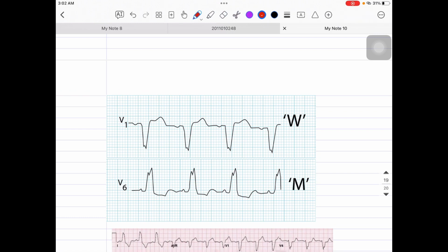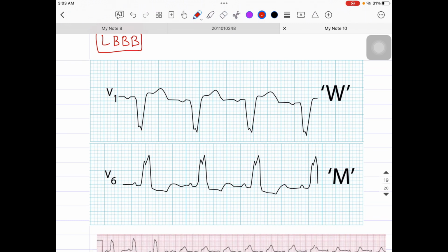So now guys, once we understand how to diagnose a patient with LVH through the ECG, we shall move on to left bundle branch block, LBBB, and how to recognize LBBB in the ECGs of the patient, right? So over here again, guys, we need to focus on two things. One is lead number 1 and another is V1 and V6, just like in LVH we were talking about.